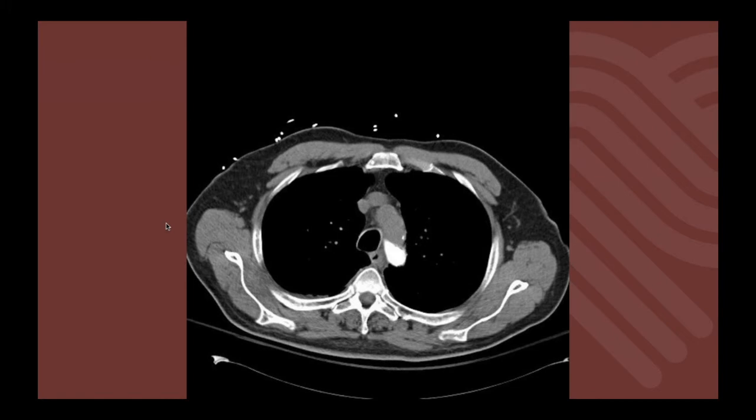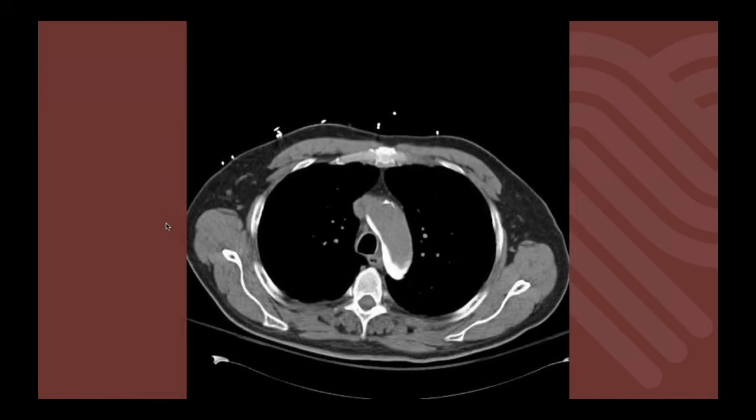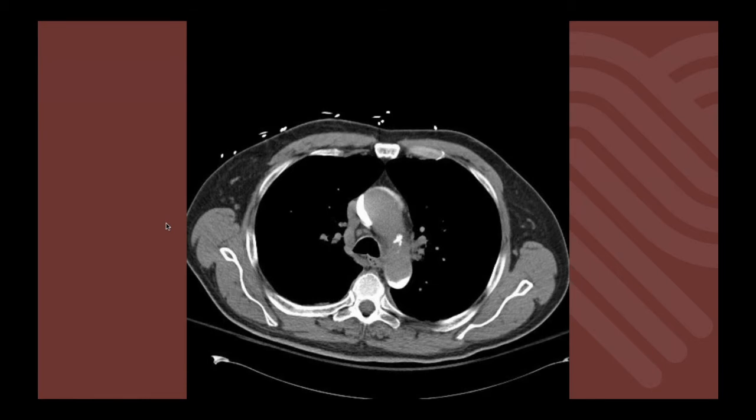And this is a CT when the patient was brought straight to the scanner. And you can see there that contrast in that false lumen surrounding the aorta. That's all from the original angiogram. There was no contrast given for this CT exam.